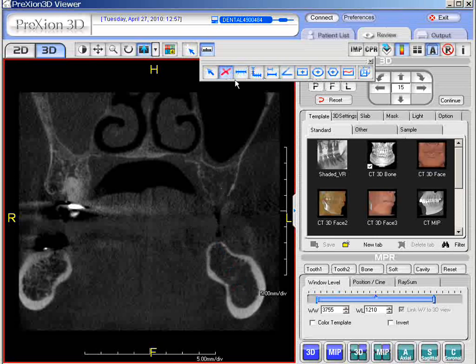If one wishes to keep the toolbar open, rather than closing it, you can hit the arrow, the blue arrow. It says selection. Think of it as neutral. In your automobile, you're in neutral position, but you still have the ability to select these particular functions. So the other thing about the neutral position is, let's say you do a measurement, and we'll go back to what we just did.